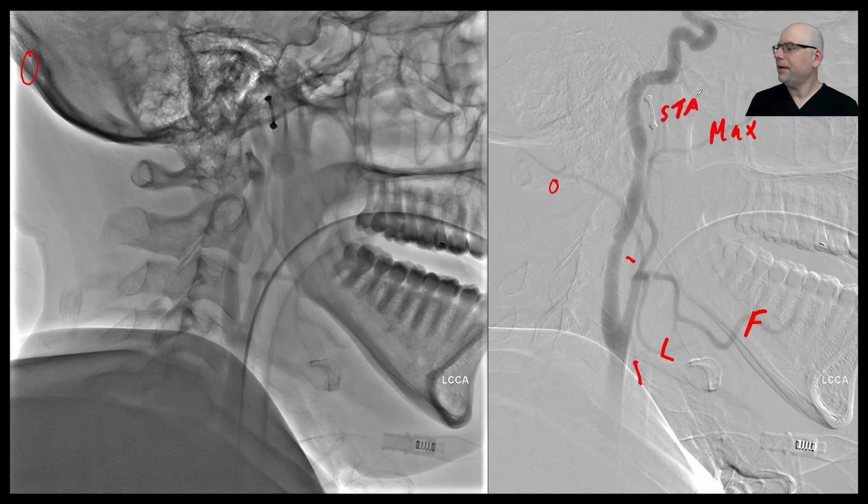So unless we're talking about bleeding from a base of the tongue cancer or something like that, the main arteries that we're going to be talking about from a neuro perspective would be the occipital artery. If the patient has a dural AV fistula, oftentimes that artery is very dilated because there are little branches going through the skull and draining directly into the transverse and sigmoid sinus. Of course, the superficial temporal artery, for the rare patient that needs an extracranial to intracranial carotid bypass.